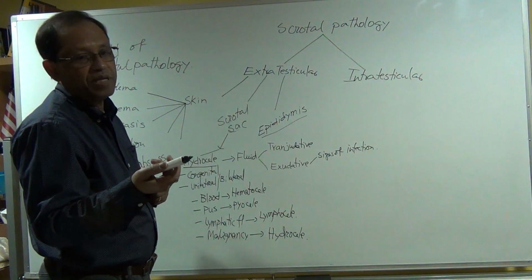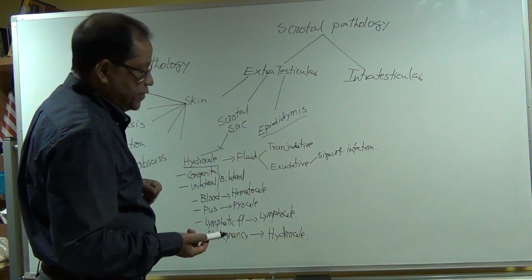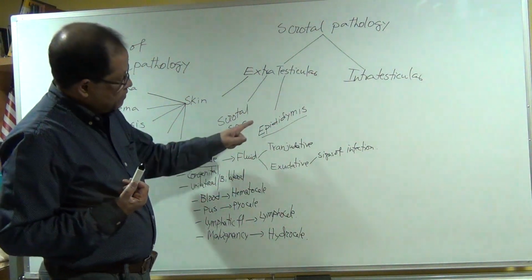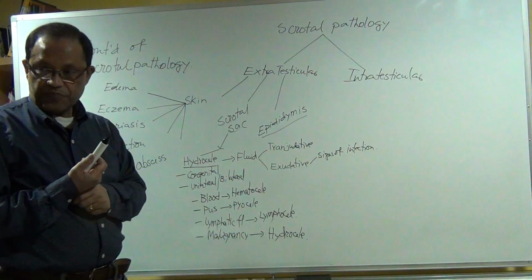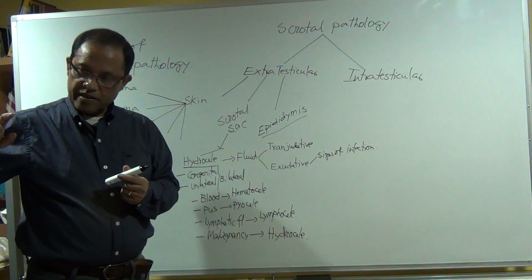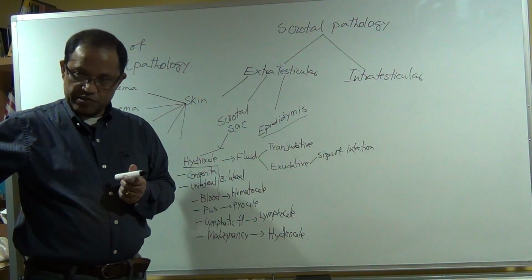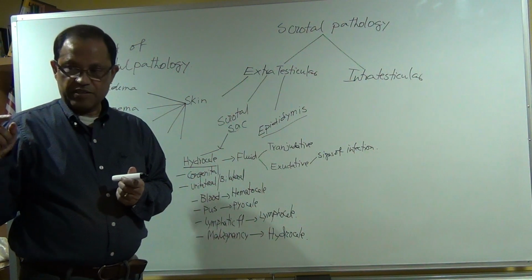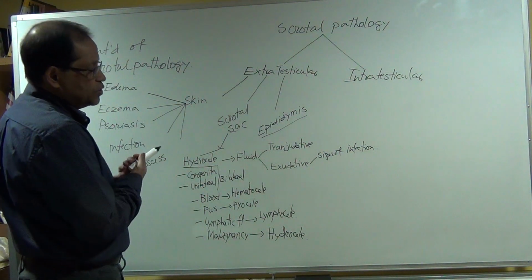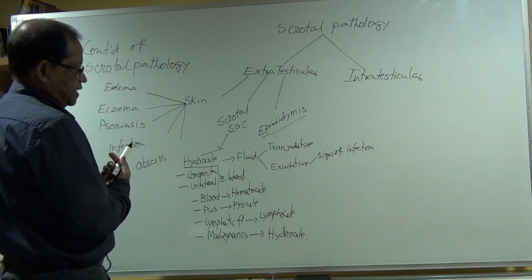We call it epididymitis, and it can be acute or chronic epididymitis. If there is an acute epididymitis, then what's going to happen? The patient complains of pain, temperature, swollen, edematous, congestion, and lack of function, right? Yes. So all those things you can see, and also there will be reactive fluid collection in the scrotal sac.